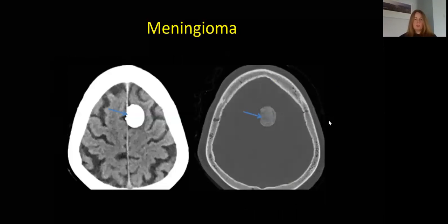If you've got a meningioma that looks like this, so clearly quite a broad base against the falx, pretty obvious, it's heavily calcified, really can't be much else. This is much more straightforward. This image actually gives you a reasonable indication of whether you think it's intraaxial or extraaxial. So on imaging, the features that it's extraaxial are usually that you have compression of the underlying brain, and you might often see a little CSF cleft going around the lesion. So you don't see the CSF cleft here. You might see a CSF cleft if you did an MRI.